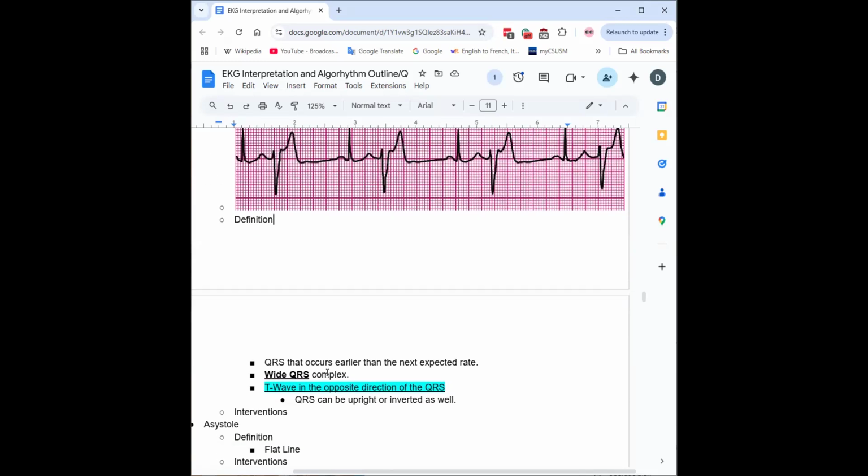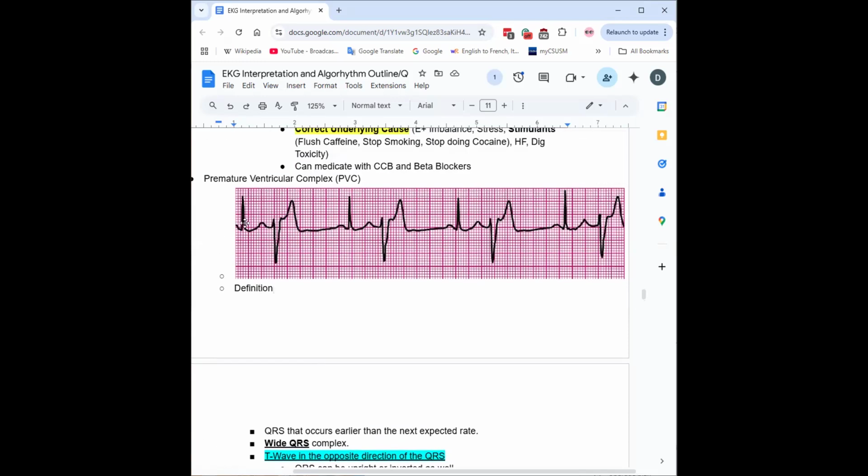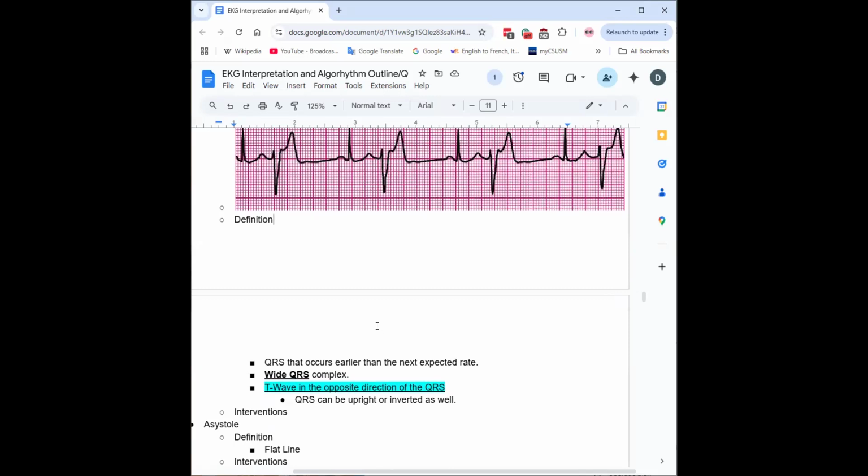the QRS, I believe by itself, right? Right, Caitlin? Yeah, it's just the QRS occurs just by itself, without the P, due to some irritability. Yeah, which is why checking for a P before every QRS is something that you assess.